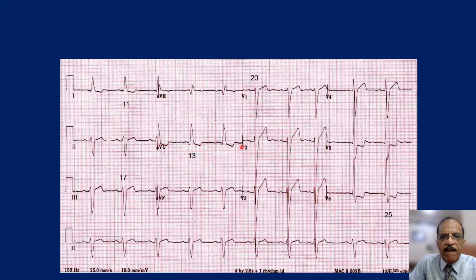If you see separate boxes here, then the criteria for precordial leads should be applied according to these boxes. So first note this one, and then note if there are additional boxes here. After making sure that the ECG is recorded at standard deflection, let's proceed with the analysis.